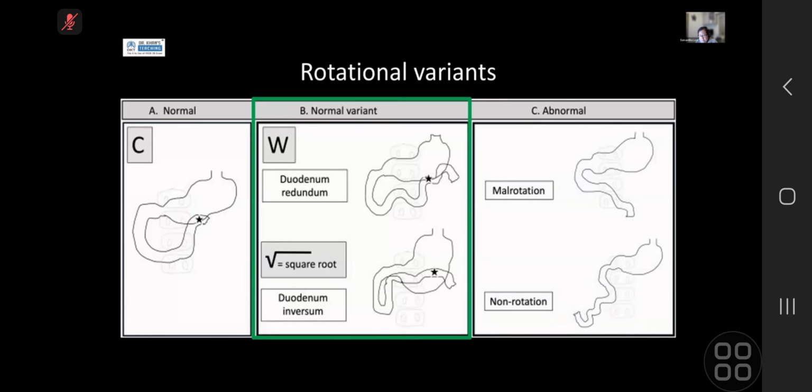Duodenal web versus duodenal stenosis, how to differentiate? I think personally that's hard. Experience-wise, there are a few duodenal webs that we called which turned out to be duodenal stenosis. What you see before that is a hyperperistaltic bowel or duodenum, with very little contrast coming through or very delayed passage of contrast. If you tell the surgeons there is a hold-up of contrast at the duodenum where there's a transition point, I think that's good enough. They can go in intraoperatively to help out with it.